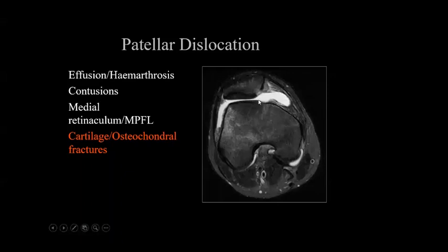Okay, so here not only lateral patellar dislocation, but there are features to assess why this patient had prior lateral patellar dislocation. And the reason is what we call trochlear dysplasia. Trochlear dysplasia is when there is no trochlear groove.